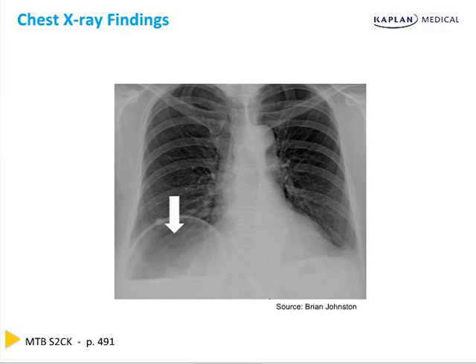One final high-yield pathologic finding that you may see on a chest x-ray on your Step 2 CK exam is actually not a lung finding at all, but rather an abdominal finding, that of free air under the diaphragm. The only place that air should be found in a normal abdomen is within the bowel, so if air is present outside of the bowel, it means that the bowel has perforated and released air into the peritoneal cavity.